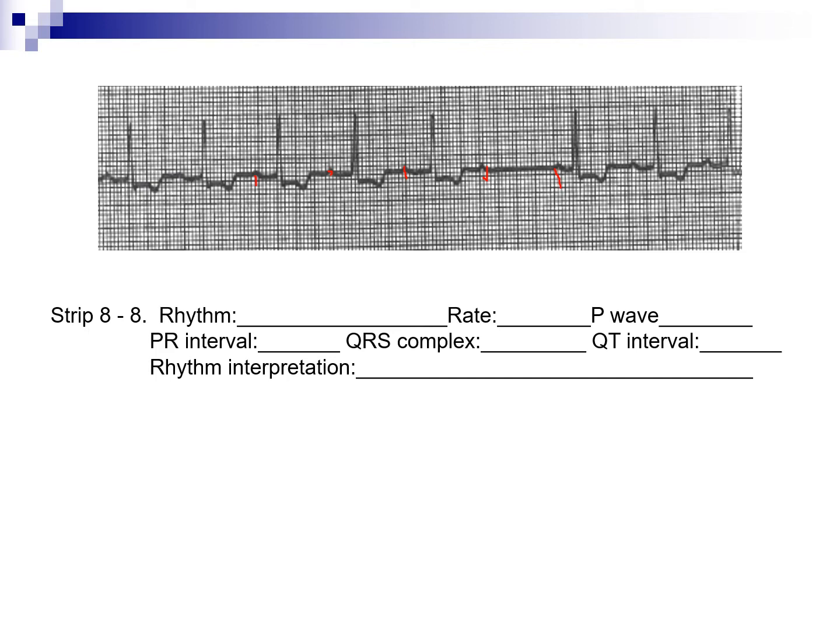Your QRS is 0.06 to 0.08. Your QT interval, you have from the beginning of the QRS to where the T wave, since your T waves are flipped, they have to come back up to the isoelectric line, so we are going to measure that as 0.36 to 0.40. Your interpretation of this rhythm is second degree type 1.